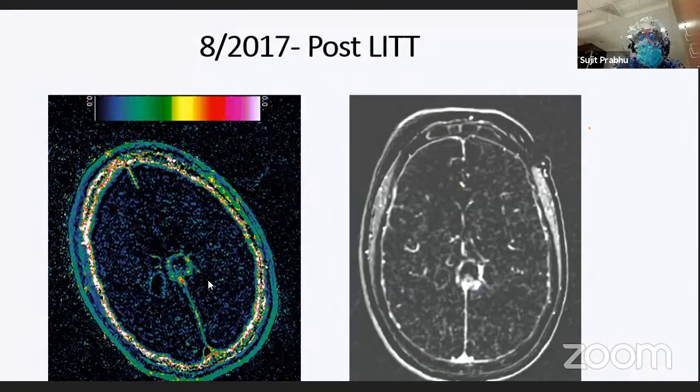As you can see, the DSC images clearly show some good treatment effect there. The scan on the right side is a subtraction image. I get this on all patients, pre and post contrast imaging scans done in the intraoperative MR.